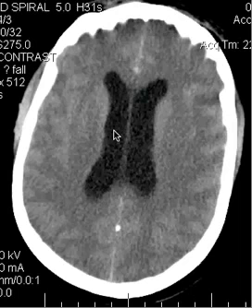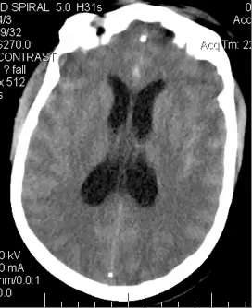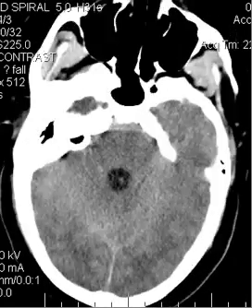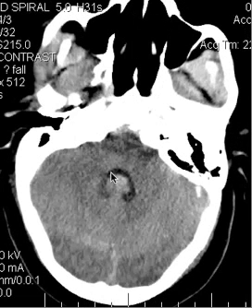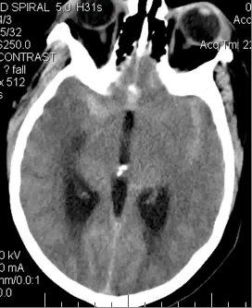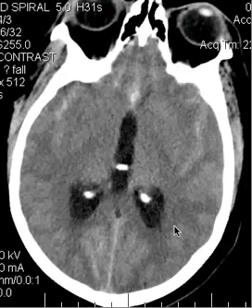So this tells you that this ventricular size is a result of obstruction, and obstruction from the subarachnoid blood, which may indicate blood obstructing the outlet of the fourth ventricle. And you remember there are two outlets. One is the midline foramen of Magendie, and the other is the lateral foramina of Luschka on both sides. So that would presumably underlie the size of the ventricles, which is increased here.